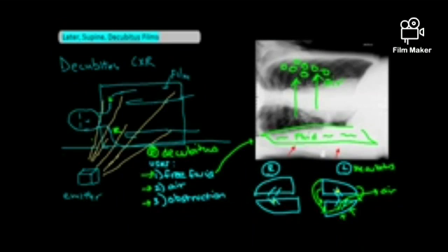However, if there is an obstruction in the dependent lung, when the non-dependent lung compresses it, air can't get out. And so as a result, the dependent or lower lung does not appear smaller on the decubitus film. And so whenever you take decubitus films to look for obstruction, the decubitus film that has the dependent lung not changing in size is the side with the obstruction.